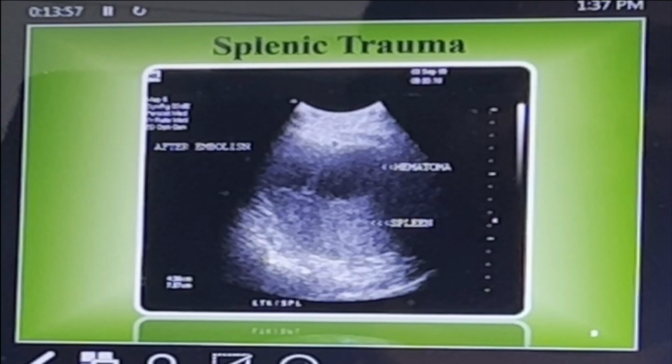With the course of time, echogenicity will go down, because the blood will clot and the color of the blood will be transformed. So the echogenicity would be less. If hematoma is old, you will get a hypoechoic area. But if it is fresh, then it would be echogenic.